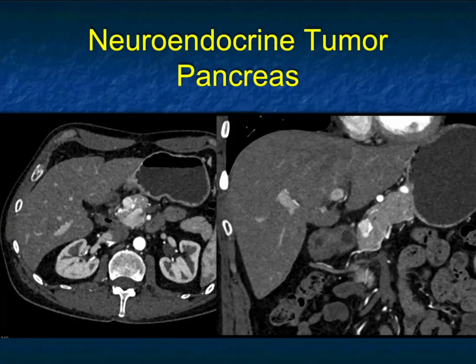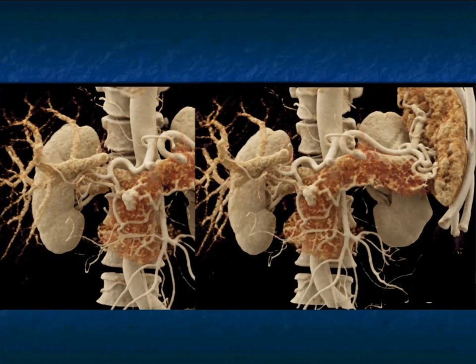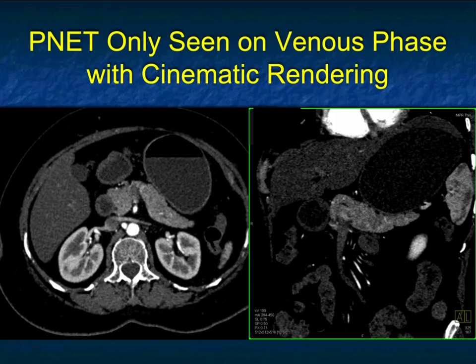Here's a lesion again near the patient's body of the pancreas, hypervascular. Here it is sitting adjacent to vessels. That's the lesion. That's the normal gland. Look how nicely this stands out. Remember, we showed you adenocarcinoma a few moments ago, and that stood out as kind of a negative. Here, this is a positive, typical neuroendocrine tumor of the pancreas. And these things are often missed. Remember, we just published an article that shows that radiomics can detect tumors more accurately than radiologists.